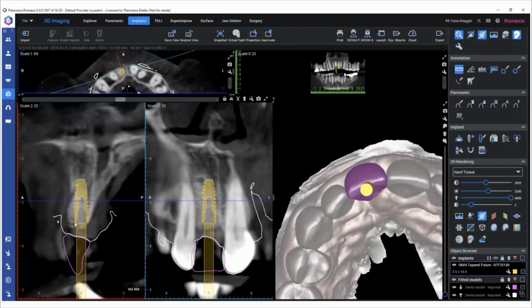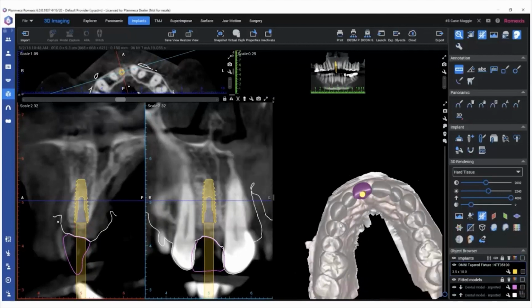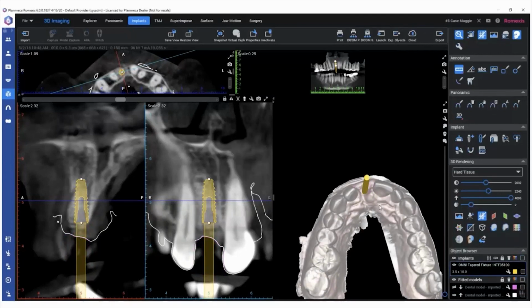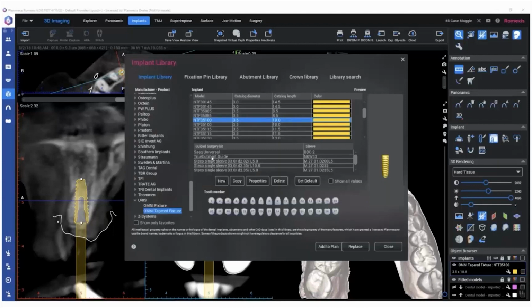That is where having an idea of where that gingival margin truly needs to exist is critical. With a stock tooth library tooth, we may miss out on that landmark, and therefore you may not get the perfect implant depth.